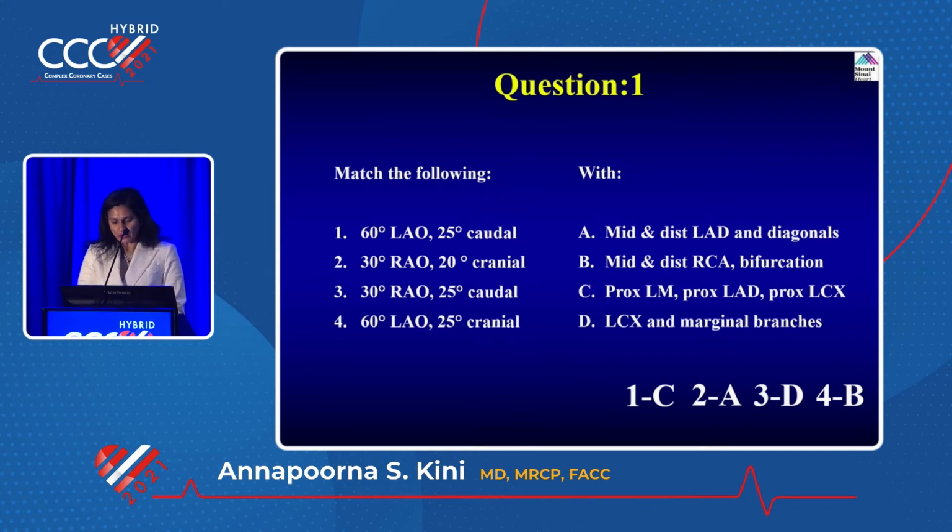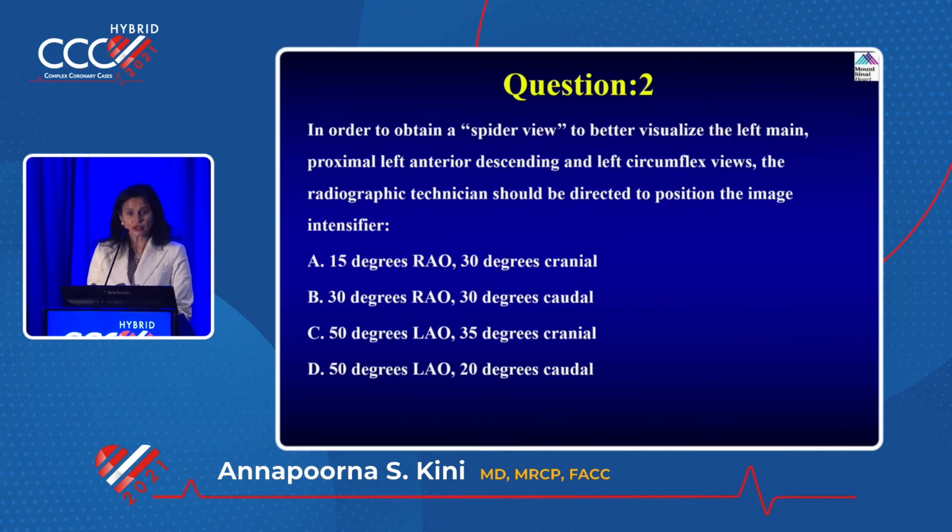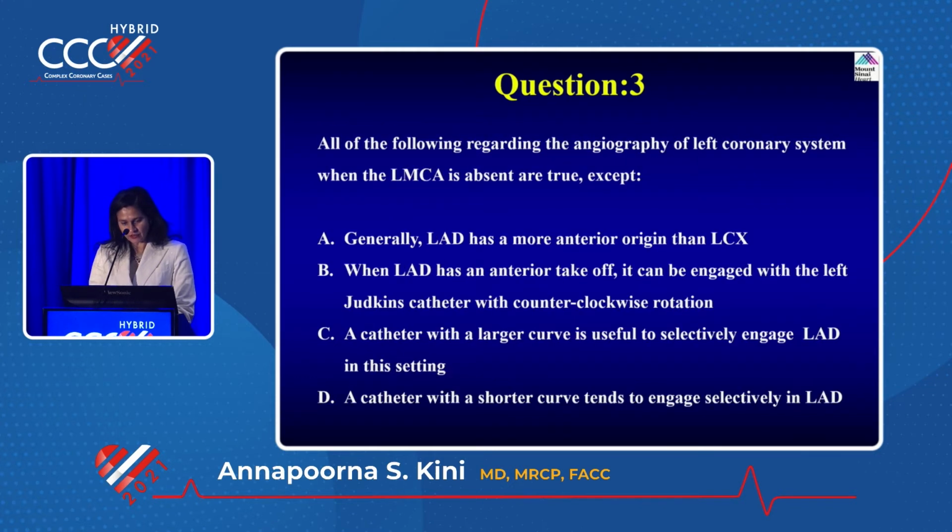They will not give you questions like this. We just created questions so that you understand, okay? They'll give you a case history and show some angiogram and then ask you some questions like that. So spider view, what is a spider view? Which one will you pick here? D or C? So no, D. Okay, that's caudal view.